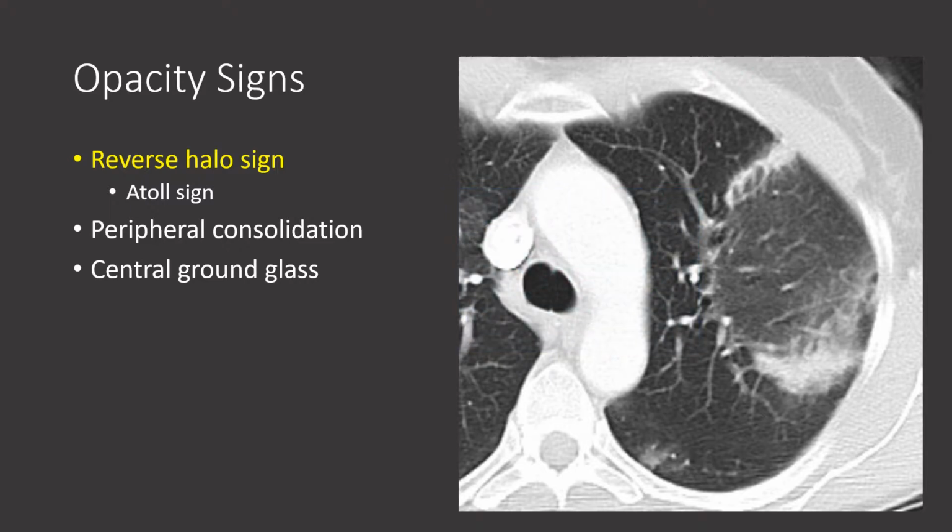Again, note the peripheral consolidation and central ground glass opacity, representing the reverse halo sign, also known as the atoll sign.